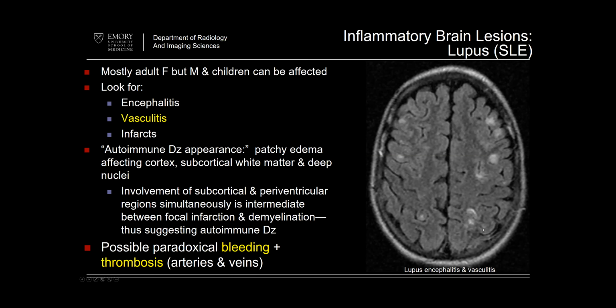Again, non-specific, a lot of white matter disease here, secondarily involving the cortex, multifocally involving bilateral cerebral hemispheres, a little more on this side than that side. You could maybe wonder, is there a border zone involvement as well? But getting the history, knowing about that is helpful. You can think vasculitis, vasculopathy, again, with the other findings that we saw before.